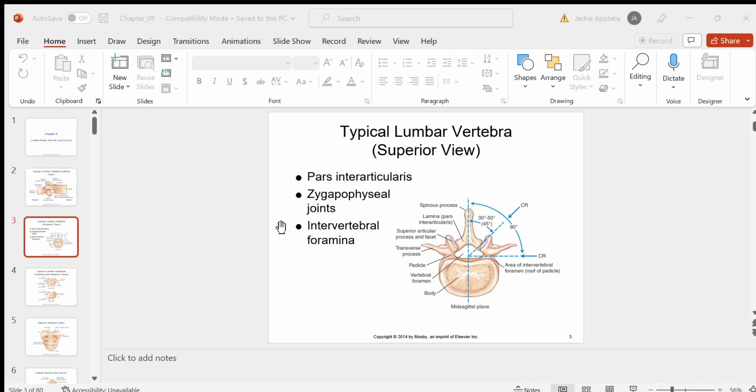The next image is our anterior view. This is the image that we're getting, or something very similar to it, when we do the AP projection. It doesn't matter if they're AP or PA, both projections are a frontal view. Both projections are going to show you the vertebra from what looks like the front. When you look at the vertebra face on like this, you should notice that above and below the vertebra hang those articular facets. They extend above and below the vertebra, so you can see those.